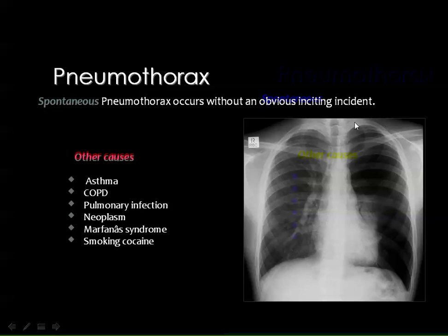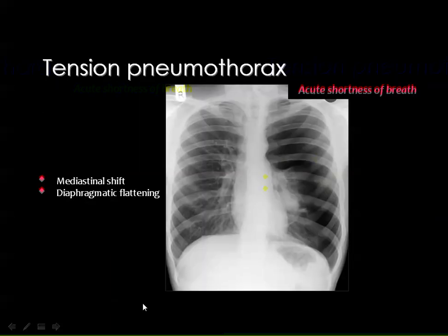Then whenever the pneumothorax is one of the conventional or ordinary pneumothorax, I mean not a tension pneumothorax, you have a central mediastinum and the normal appearance of the diaphragmatic copula. But whenever you see that the pneumothorax is associated with depression of the diaphragm or flattening of the diaphragm and the contralateral shift of the mediastinum, then you are dealing with a case of tension pneumothorax. And here you can see some minimal shift of the mediastinum with subtotal collapse of the lung against the hilum and the depression of the ipsilateral diaphragm, suggestive of tension pneumothorax.